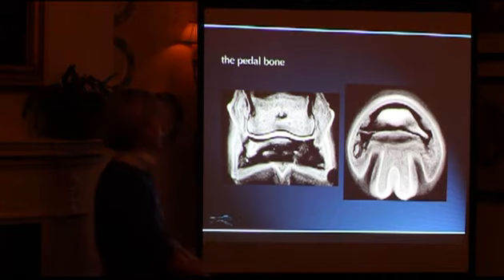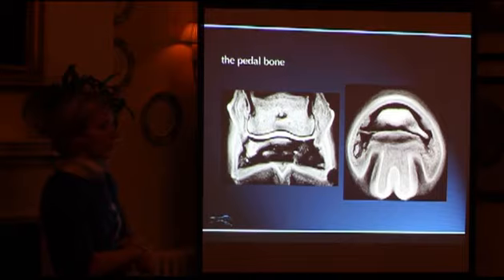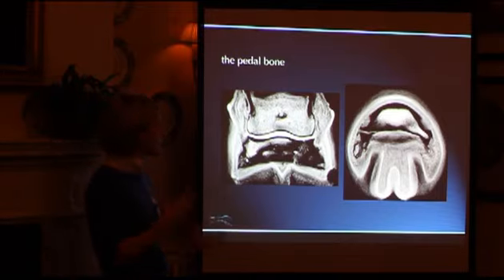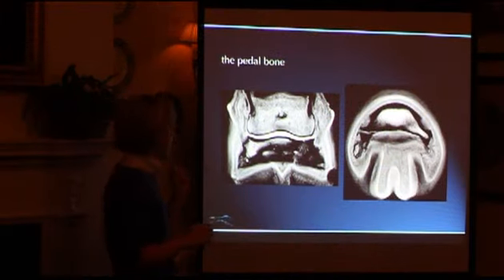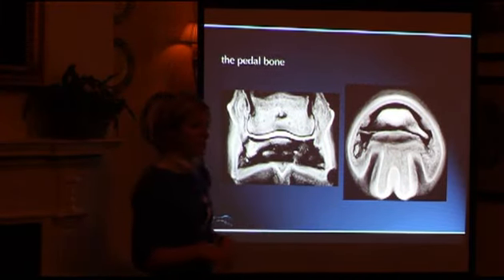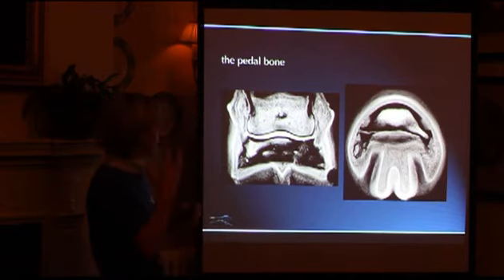You'd expect it to be getting on quite well in 8 weeks' time, and then if it wasn't, you'd put it away for a bit longer. Now, some of these horses don't come sound when you expect them to, and you think, well, why isn't this pedal bone healing despite potential radiographic healing? They're still niggling on lame, and that's where the MRI can really help you get to the fine detail of that particular case. So here, this is an articular lesion, and we've got a little defect on the joint surface, which has started off some low-grade cartilage pathology and some osteoarthritis developing.